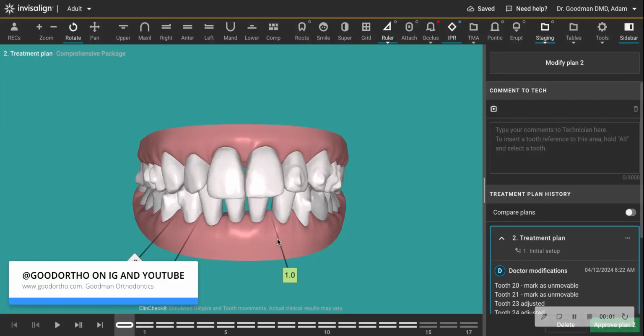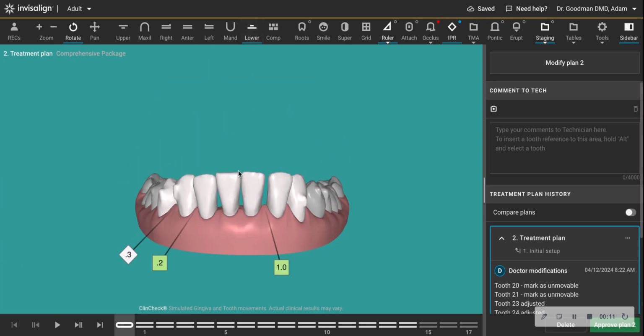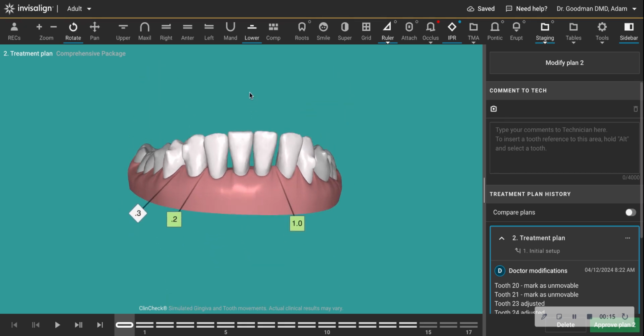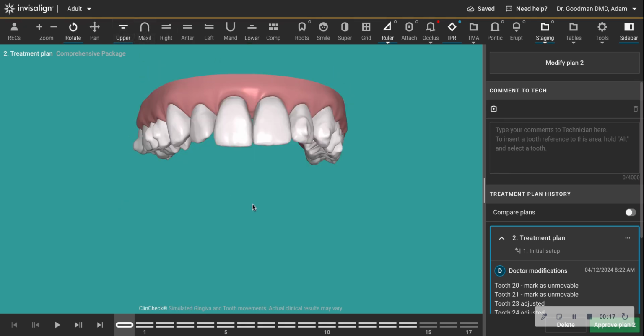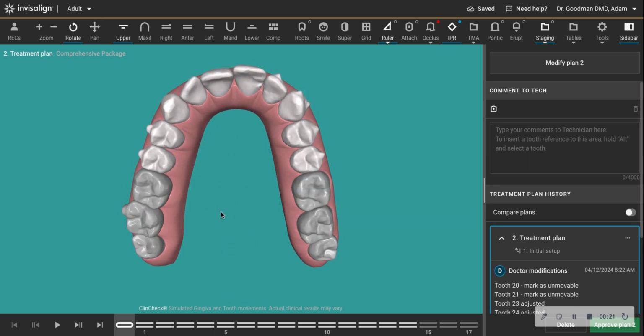When you are treating adults with either braces or Invisalign, there are sometimes some limitations, and there are some traps you can fall into. This is an adult who came in who has lower spacing and rotations, and upper crowding and rotations. She came to me, I guess, having had Invisalign in the past. You see the attachments on the teeth.